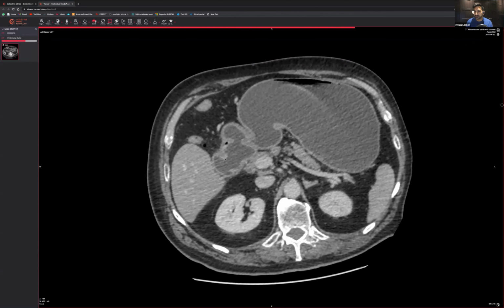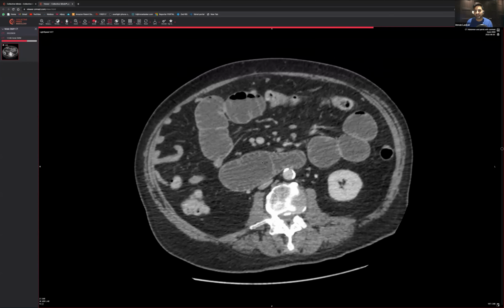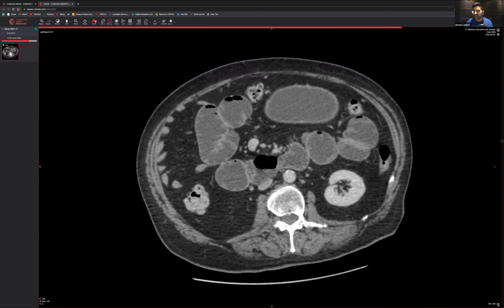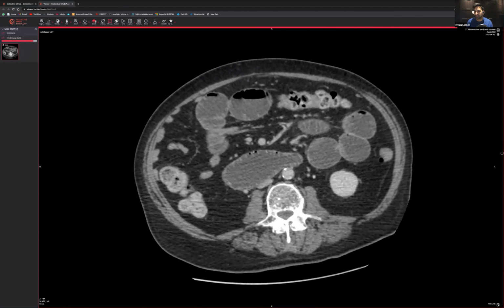The whole stomach, the pylorus looks distended. It all looks very distended, all the duodenum. Then going across to this area, this all looks distended as well. So it looks like a lot of the proximal bowel all the way to the stomach is very distended. So much obstruction is going on that there's fluid located within the esophagus. That doesn't look quite right.